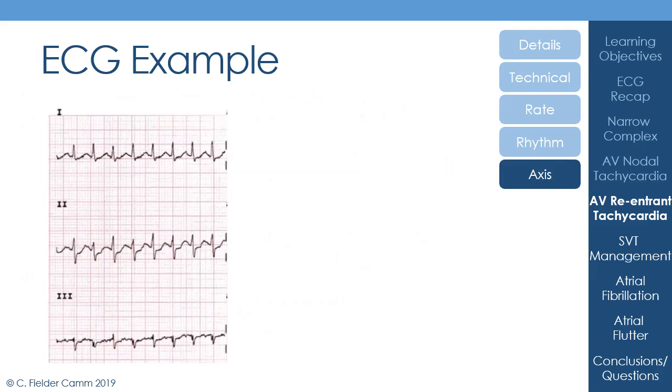Okay, so let's have a look at the cardiac axis now. If we enlarge these leads here, and we take our normal graph, looking at lead 1, we can see that that's predominantly upgoing. Upgoing means that it's coming towards the lead, and so we can get rid of everything that's on that left-hand side of the graph because it must be coming towards lead 1.